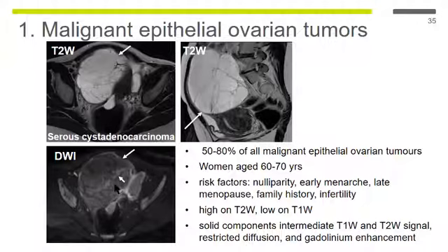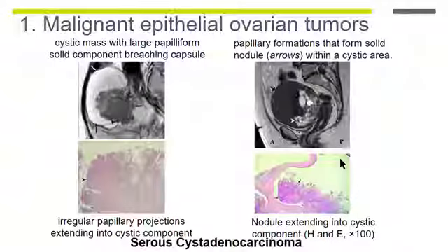They're complex cystic masses that must be considered malignant, and they are basically in middle-aged women of 6th and 7th decade, and they have this appearance of high on T2 with low on T1 on the cystic components together with the solid components, as I said.